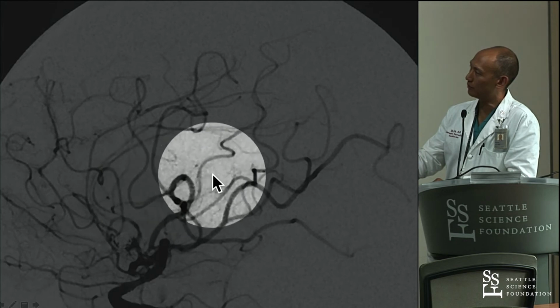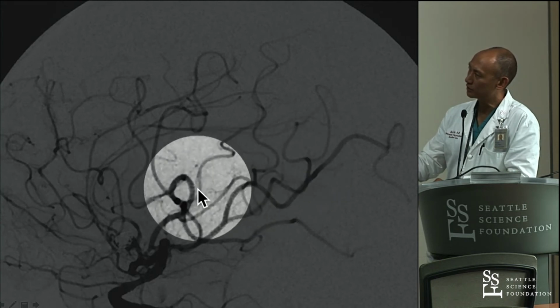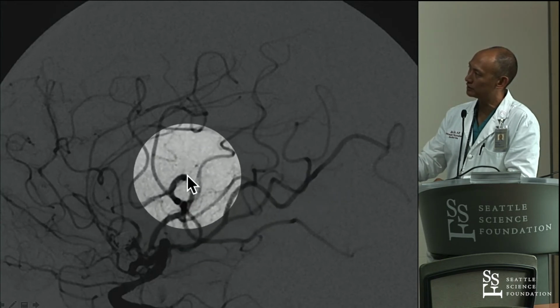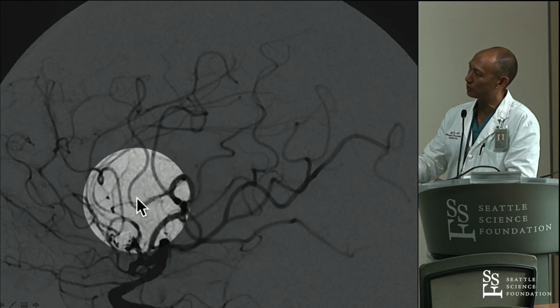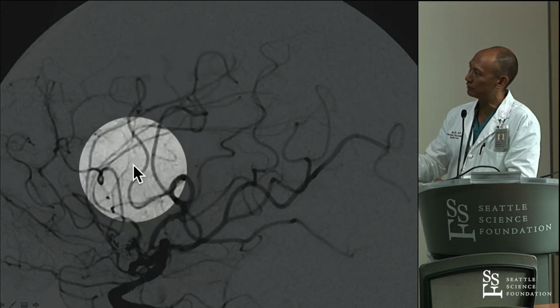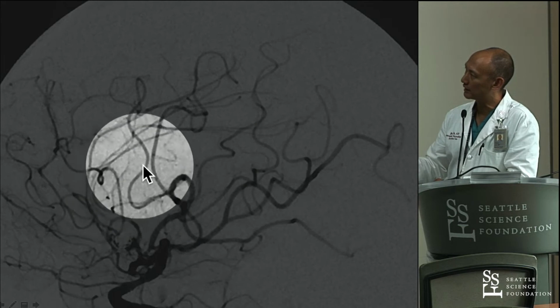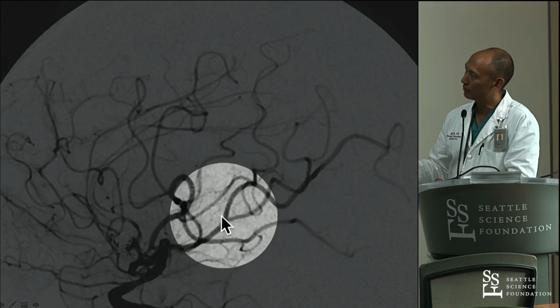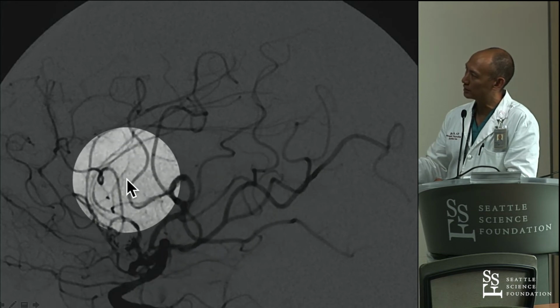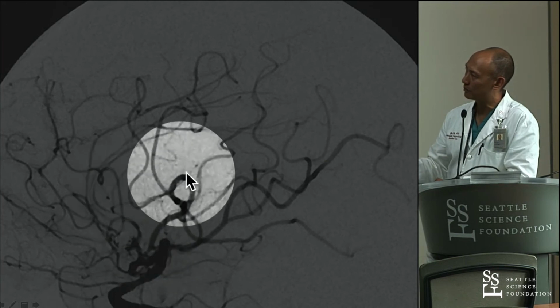If you draw a line from all these arteries actually hitting something, that's actually the roof of the sylvian fissure. And so that's a transition from an M2 branch segment into an M3 segment. So it's hitting the roof of the sylvian fissure, wrapping around the frontal operculum, and then coming out of the sylvian fissure itself into these cortical branches. So this is an isosceles triangle, moving from anterior to posterior, and it's larger anteriorly than it is posteriorly. That sylvian triangle is an important identifying landmark.